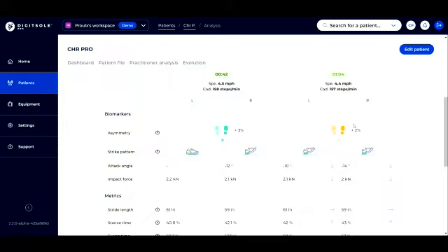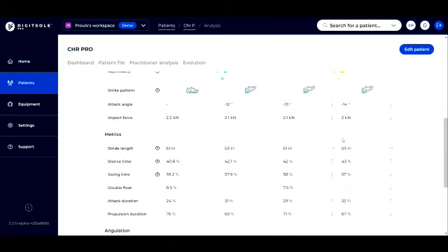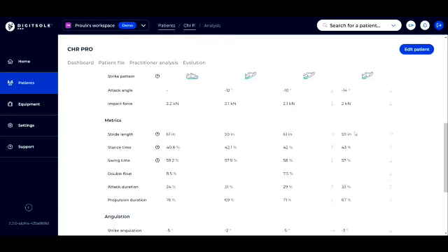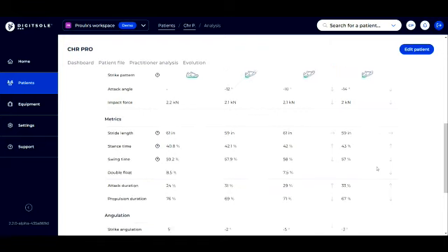So we start to see some potential changes or differences. And I will say that's just a miscoloration because I'm using a different system at the moment. But we start to see, oh, looky here. Now the person was actually heel striking more normal. And so maybe everything returned, or this was just a fluke over here. If they were just running like that, maybe they were itching their leg, whatever the case may be. But this just allows you to make some comparisons.